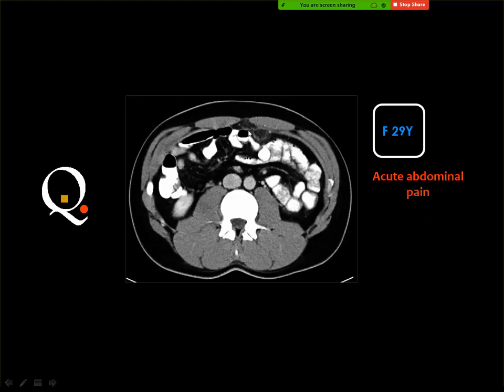And this is, yes, very good. This is epiploic appendicitis, and you see enhancement or thickening of the parietal peritoneum with the fat within the appendices epiploicae. Very good.